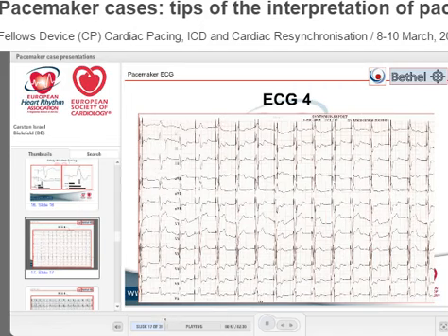Is anybody in the room who sees a nice P wave? That is already 50% of the diagnosis. This is a rhythm without a P wave. Is the intrinsic rhythm regular or irregular? In fact, it is very regular. I'm not sure if you can take calipers on your printouts. They're a little bit small, but I just tell you this is regular. So intrinsic rhythm, let's say about 70 beats per minute. Regular, no P wave. Also, to be honest, no fibrillation or flutter waves. Any suggestion?